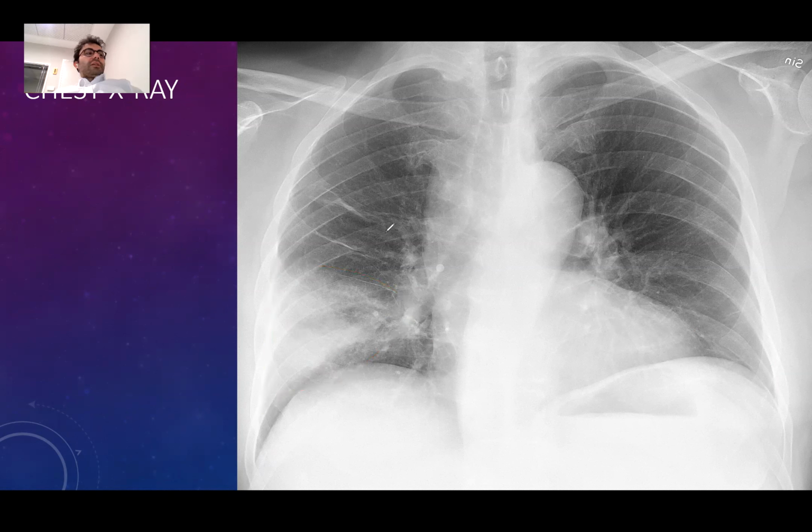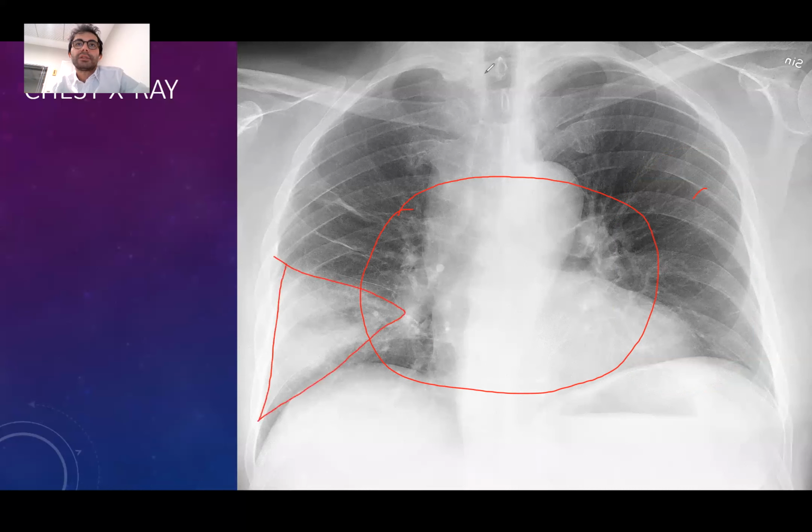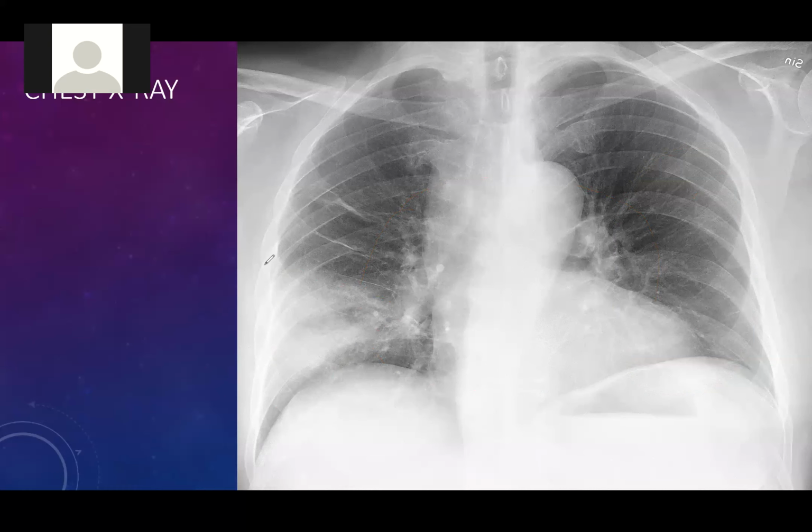I agree with you. When you look at the enlarged heart, maybe it's heart failure too. That's a mistake, because heart failure is a systemic disease, so all of the lung is supposed to be affected, right? It should be diffuse, you mean? Yeah, I understand. The left lung is completely normal. If you call this a heart disease, it's minus in the oral exam. It should be more systemic, and the consolidations are supposed to be in the middle, right? It was different. It was not like this. This is more like a triangle, which is resting over there, like I said, the lower one. So it's pneumonia or something like that.